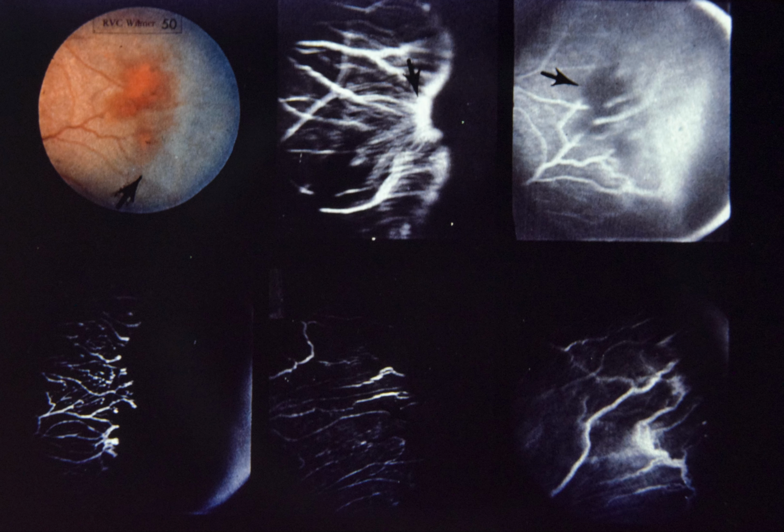Upper center, in fluorescein angiogram taken same day as upper left photograph, note area of non-perfusion temporally where retina is avascular. Arrow denotes mesenchymal shunt at edge of vascularized zone of retina connecting arteriolar and venular branch vessels.